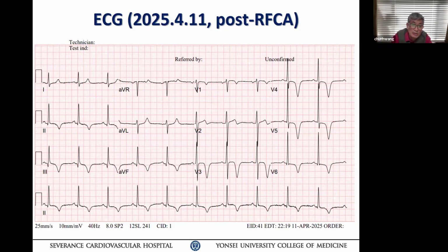But unlike a cerebral T wave, where typically you would have a bradycardia, the patient's heart rate is normal. So this is most likely cardiac memory. Remember that symmetric T waves are pathologically abnormal, but can happen after ablation of a posterior septal pathway or after ventricular pacing. So you have two types of cardiac memory: pace-induced, and abnormal ventricular activation by an accessory pathway, especially posterior septal pathways.